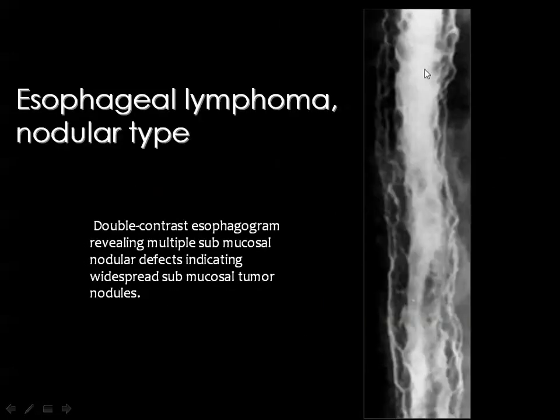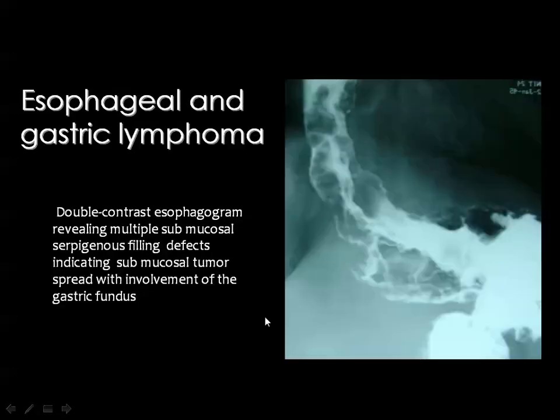This is one of the, let us say, diagnostic forms of submucosal esophageal infiltration, and is not of course specific for lymphoma, but if you see a good segment and submucosal infiltration, one may suspect this diagnosis.